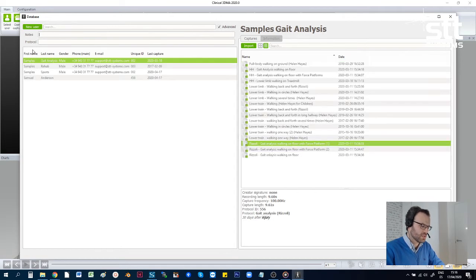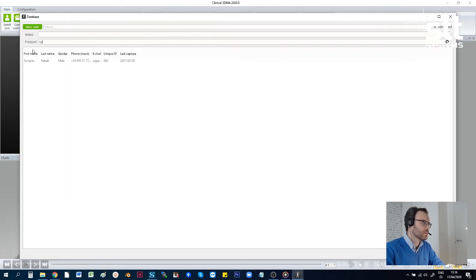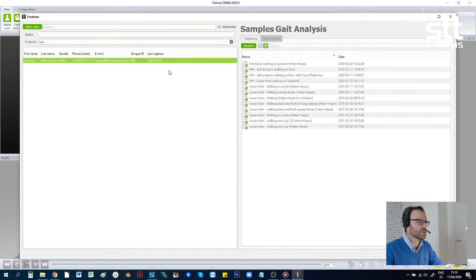Or I could look for a specific protocol, Helen Hayes, and then all the Helen Hayes captures are within this particular patient in this case.